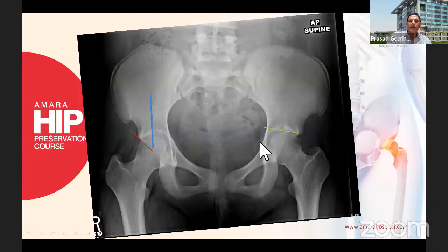And the teardrop is reversed a little bit, right? The medial fossa is actually medial to the Köhler's line. It's reversed. And if you measure, look at the weight-bearing axis going up. The weight-bearing axis goes medial to the sourcil. So it's loading non-articular, or a place of the acetabulum that does not have any articular cartilage. So this is going to cause arthritis eventually.